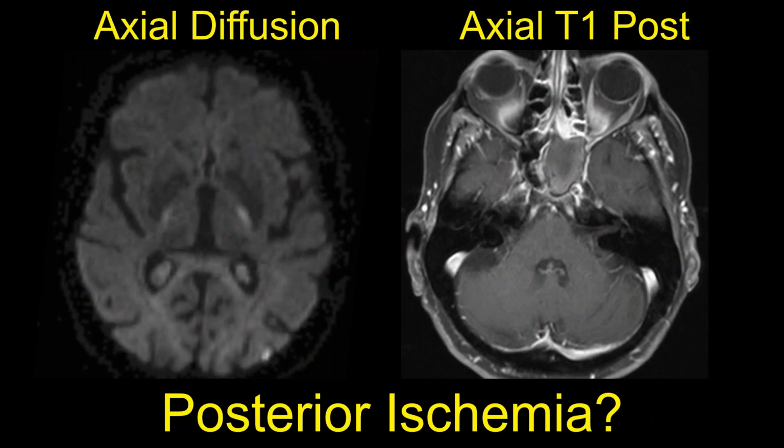Now, sinus disease can get very bad very quickly, especially from the sphenoid, because the sphenoid sinus disease, immediately lateral to that is the cavernous sinuses, where we have the internal carotid artery, and we have cranial nerve 6, and then the lateral wall of the cavernous sinus, we have cranial nerves 3, 4, V1, and V2 going down the wall. So this is a MRI study that was done.